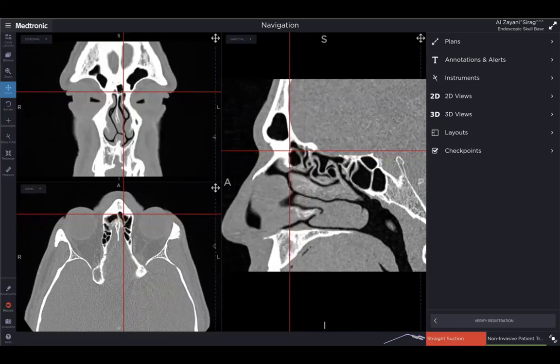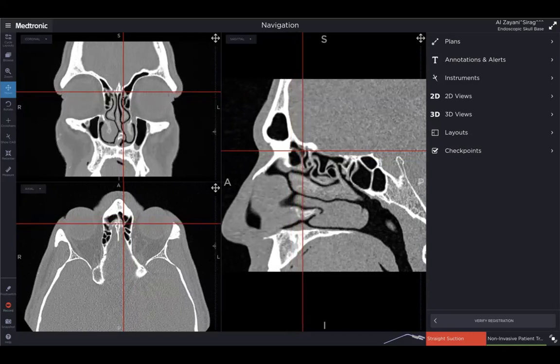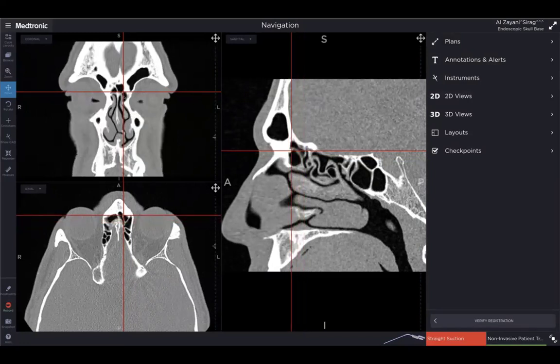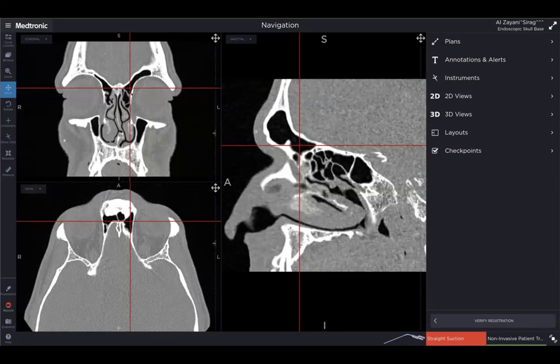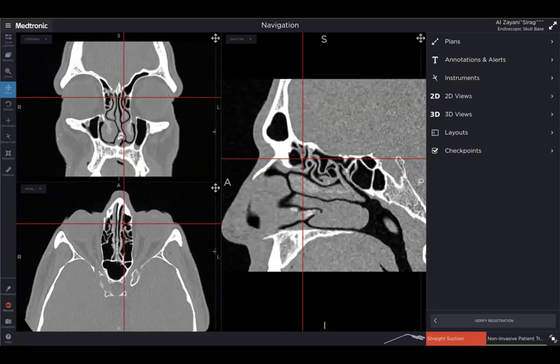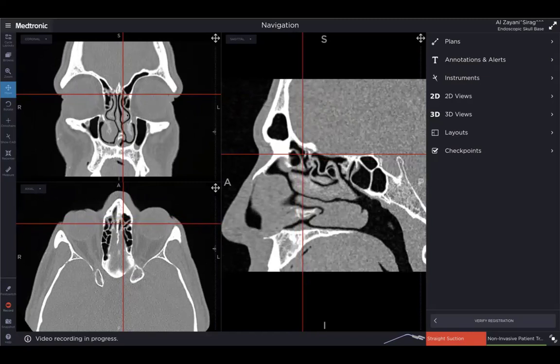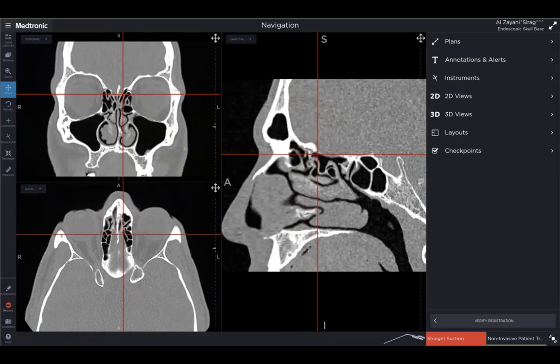because the drainage pathway is anterior and medial to the drainage pathway of the big cell that was thought to be the frontal sinus. So what we thought was the frontal sinus on the left side is actually a supraorbital ethmoid cell because it drains posterior to that cell in the midline. If that cell in the midline drained into the frontal sinus, then that would be an intersinus septal cell. But it has a separate pathway draining into the nasal cavity, and it's just medial to the uncinate process. So very, very complex frontal recess.